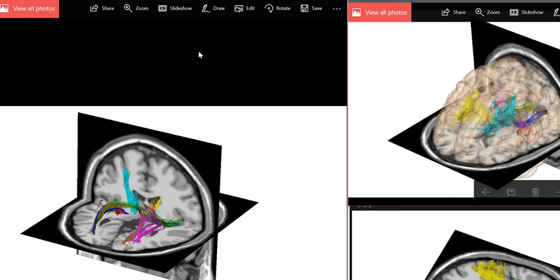So it'll give you some idea of the direction, and then the colors in between the endpoints of the effective connectivity will be z-scores that are signaled by the color of the line and/or the thickness of the line. Right now it's just going to be the color of the line.